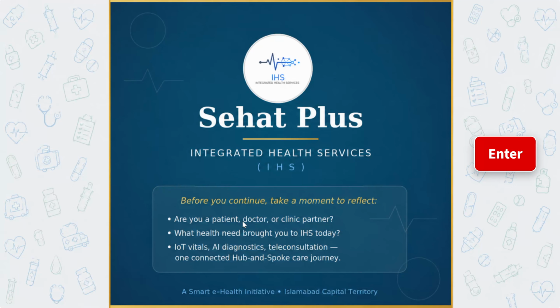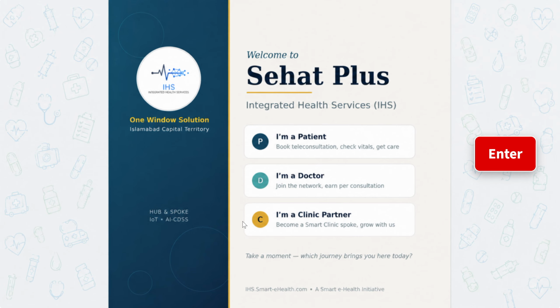Hello everyone, I'm part of the Smart eHealth development team and I am currently working on the IHS AI clinical decision support system. Today I will give you a short demonstration of the system and explain its main features.